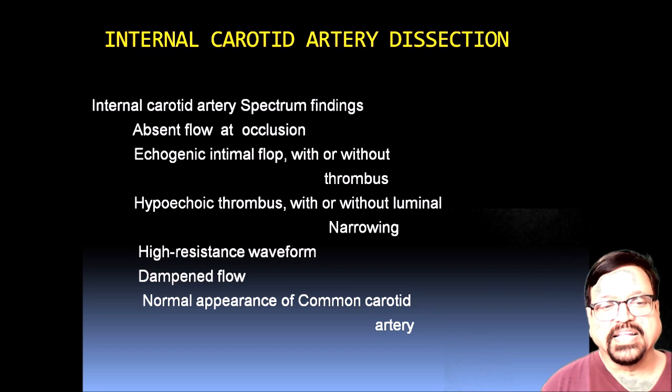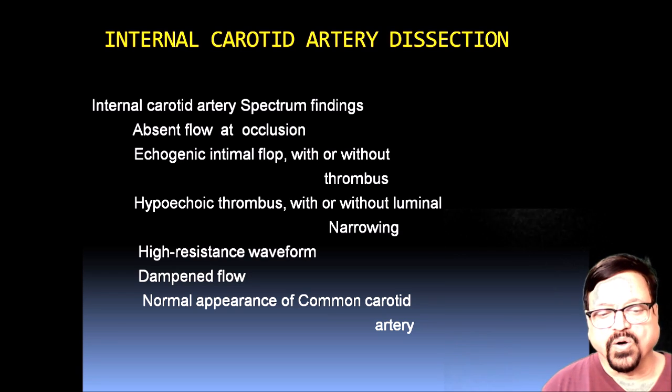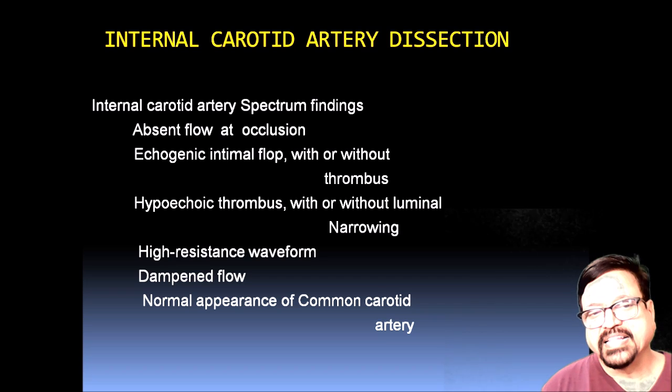If we find all these things, absent flow, echogenic intimal flap, hypoechoic thrombus, high resistance waveform, dampened flow, or it could be normal, then you can suspect carotid artery dissection.